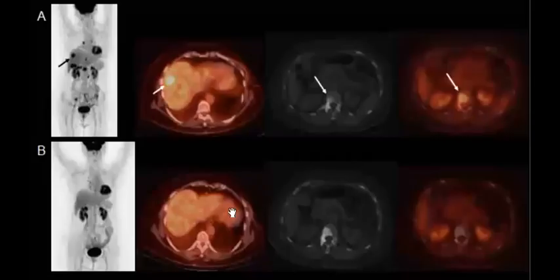Okay. Then finally, we are about to reach the final stage today with one case, and the question will be a very easy question. I wish that you will enjoy it. So what is the difference between here and here? It is the same patient, by the way.